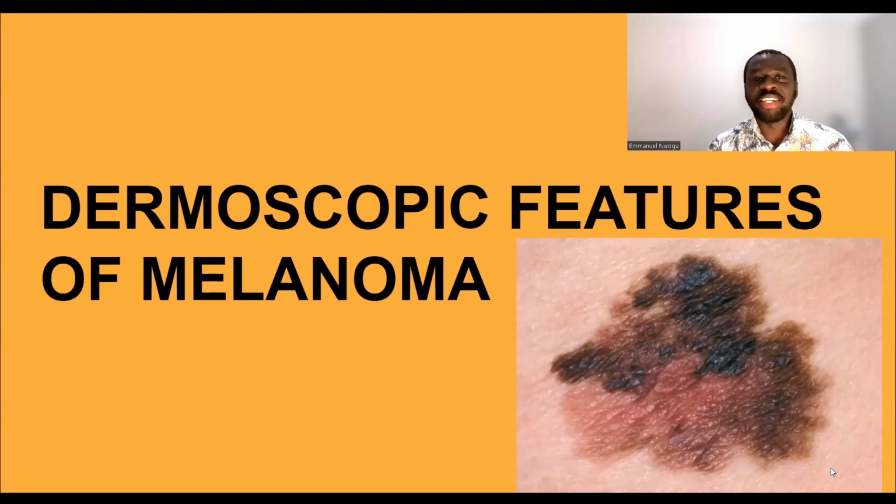Hello, ladies and gentlemen. I want us to quickly have a look at the dermoscopic features of a malignant melanoma, or more commonly called a melanoma, because all melanomas are malignant. So using the word malignant melanoma is actually an unnecessary repetition, a tautology. On this photo, we can see briefly a gross appearance of a melanoma.